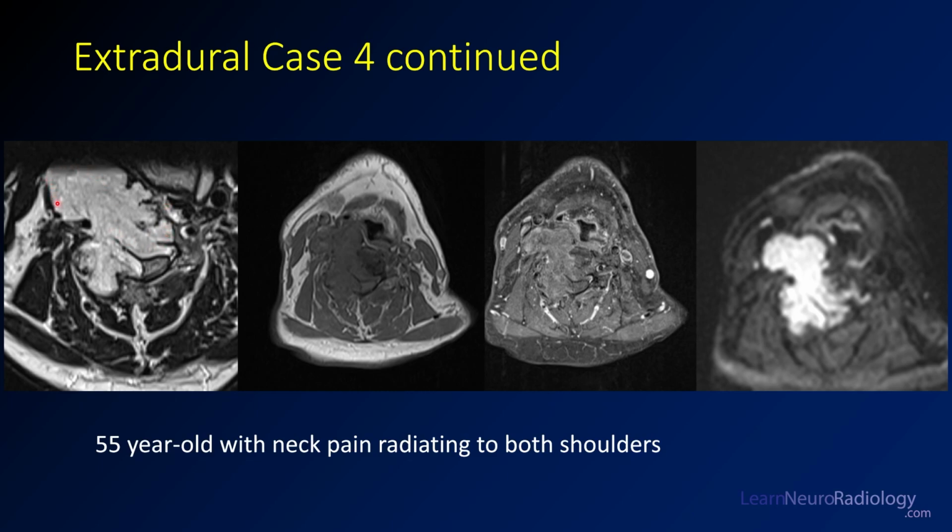It's coming into the prevertebral spaces here, going around near the carotid space, and you see involvement of the epidural space here, coming out of the bone, both posteriorly and anteriorly, and some involvement posteriorly here. This is a T2 image. Here's a T1 showing it's pretty iso-intense to muscle, hard to even see the boundaries.